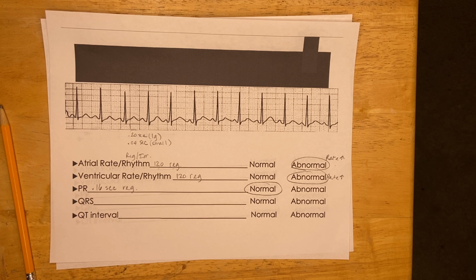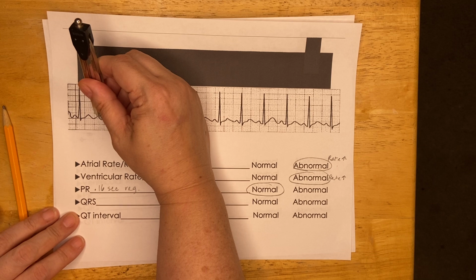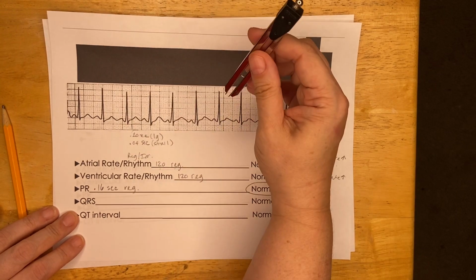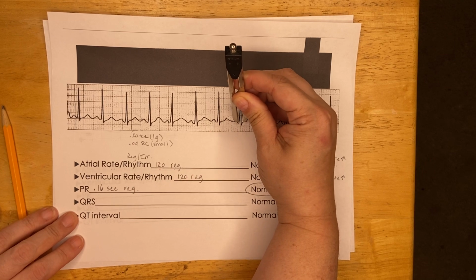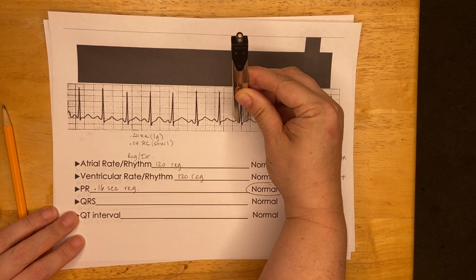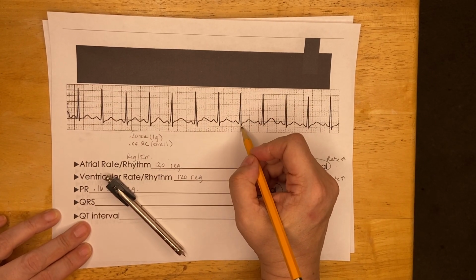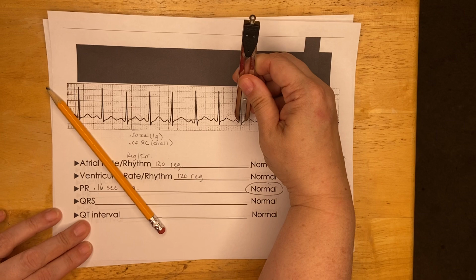Now it's time to look at the QRSs. So I want to know how long it takes for the ventricles to depolarize. So for the ventricles to depolarize, I'm going to measure from the beginning of the R. And if there was a Q, you would do that too. And you can see just lead placement. I'm looking for one that's a little easier to see. So where the R rises up off the baseline to where the S comes back to the baseline. So this is the R, the upward deflection after the P. The S is where it comes back down below the baseline, and where the S comes back to the baseline is where I want to measure.